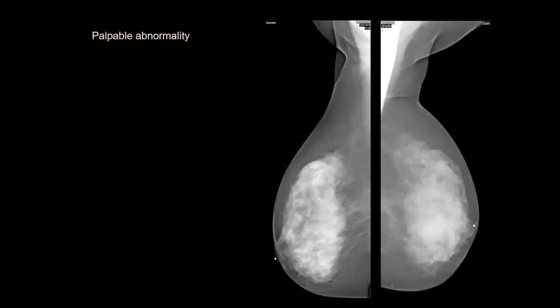Okay, what about this case? Palpable abnormality. So we are dealing with which type of mammography? Diagnostic. What is the BIRADS category? 4. Why is it 4? Sorry, just let me go step by step. There is a global asymmetry involving the left breast.